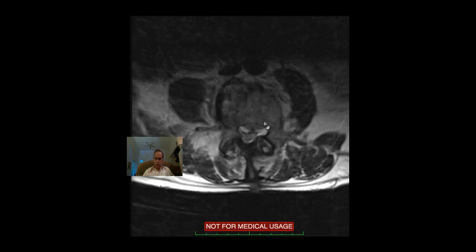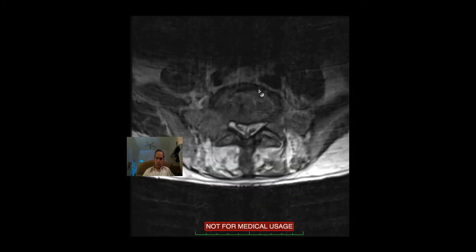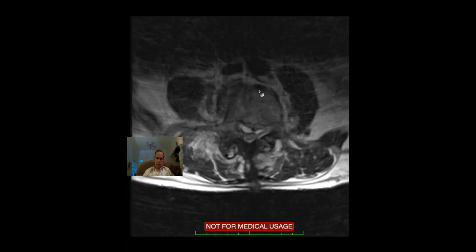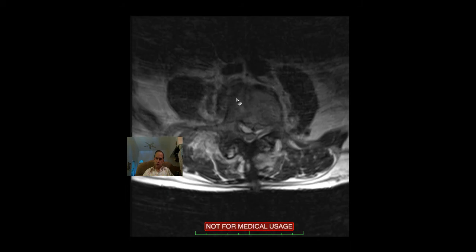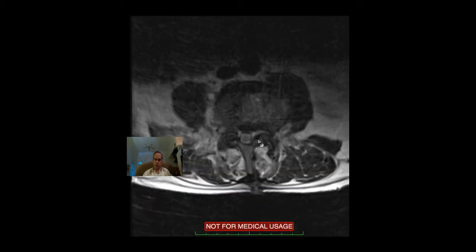Here you can see that irregularity of the L4-5 or 3-4 level. That looks like this is L4-5, so that's L3-4. You see the protrusion and hypertrophy of this aspect of the disc space and adjacent vertebral end plates at the L4-5 level. You can see how there's central canal stenosis due to posterior osteophytic spurring here, and hypertrophic changes of the right facet joint at this level as well.